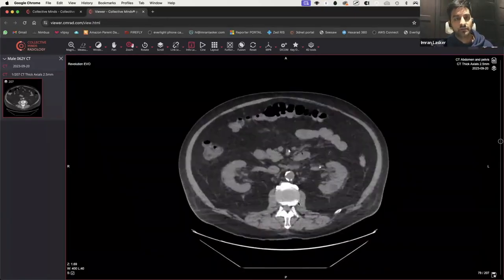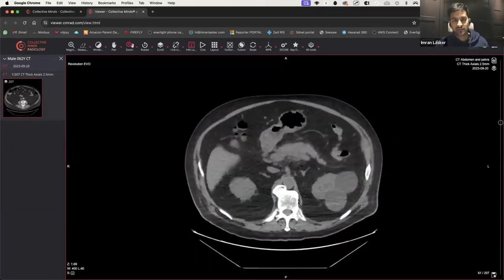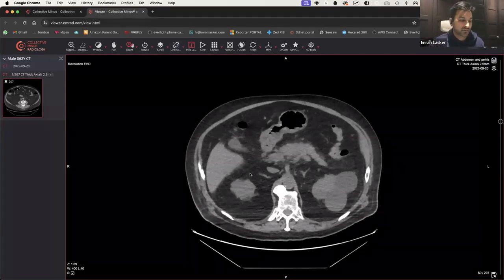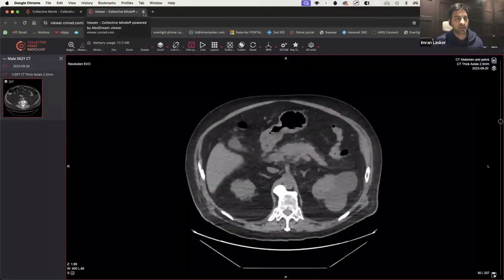In my conclusion, I would say limited non-contrast study, no kidney abnormalities, but there is some faint fat stranding around the spleen and the pancreas. This would be acute pancreatitis, correlate with the amylase. No secondary complication has been identified on the study. If there's any clear concern, I would recommend doing a contrast enhanced study, because on a non-contrast study it's going to be very, very difficult to say whether this person has a splenic vein thrombosis or anything else going on anywhere else.